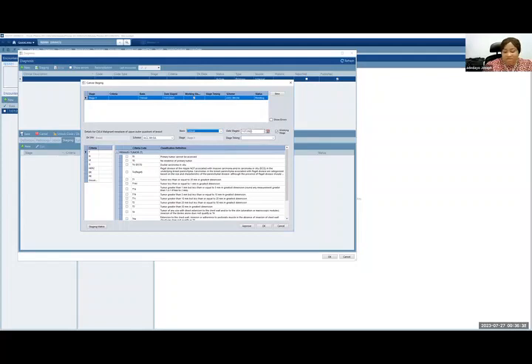And we're going to put the date staged. So what date did you stage this patient, which is today? And then is this the current working stage? I can select yes or no. If you have only one stage, it would have to be the working stage. Now, if I stage this patient today, give chemotherapy, and then she's downstaged, and I want to stage her again post chemotherapy, I can now select working stage on that new stage, and I will take it off this one, because the new stage is now the working stage, and this is the old inactive stage.